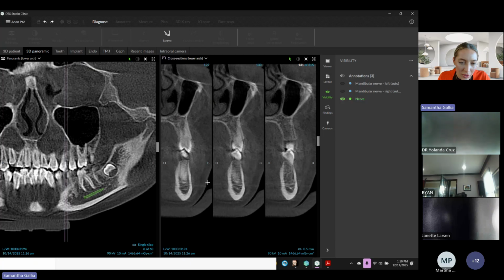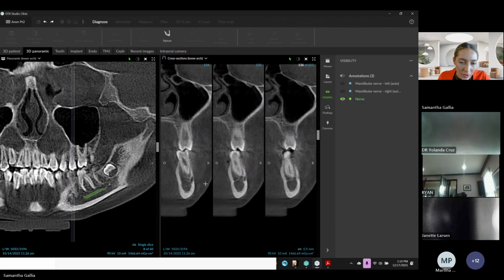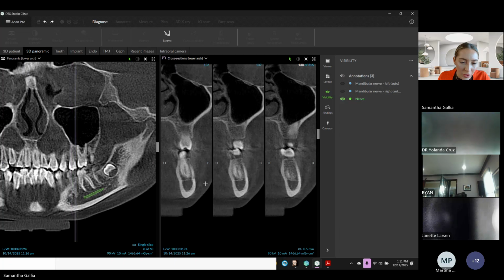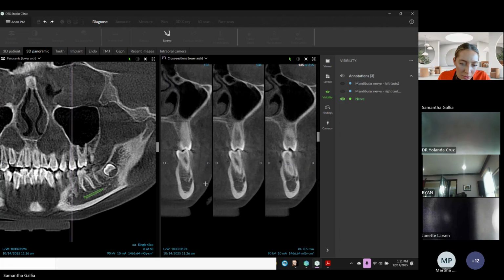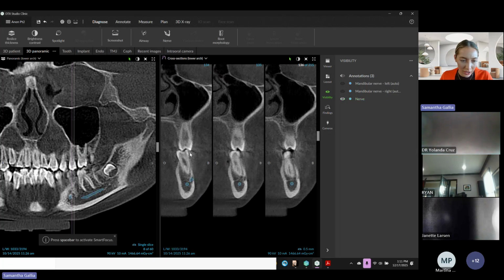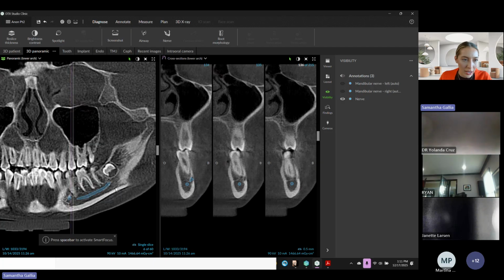I don't like that one. All right. And then when I think I've done it, I'm just going to right click to lock that in.